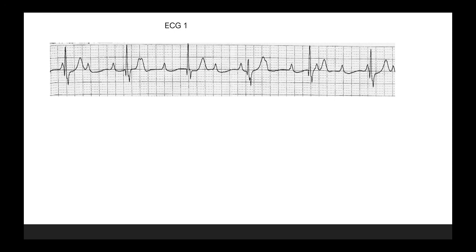So if you were to observe this ECG, you would almost immediately note that the P waves which you see appear to be all over the place. They seem to be appearing regularly on their own, but sometimes the 4th one is embedded in the T wave, and the 6th one is there in the QRS complex.